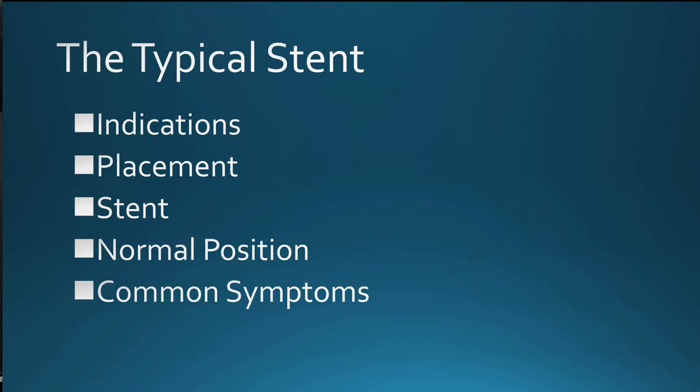Typical ureteral stent. Spend the next 5 or 7 minutes or so talking about sort of the typical or normal ureteral stent, why it's placed and how it's placed, and what it should look like when it's in its expected position, and then what are some of the common clinical symptoms, even in an uncomplicated ureteral stent.